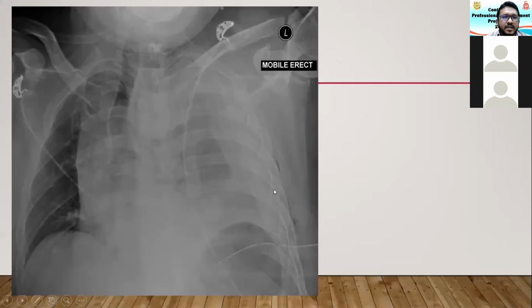So obviously the patient had a traumatic event, and there is some gas leaking into the subcutaneous tissues, but there is whiteout with small aeration of the residual lung on the left side, with the mediastinum shifting to the opposite side. That means whatever the pathology here is, it is space occupying, and it's shifting the mediastinum away.